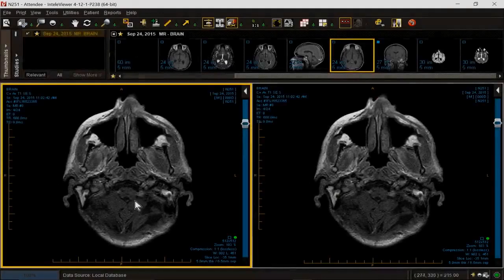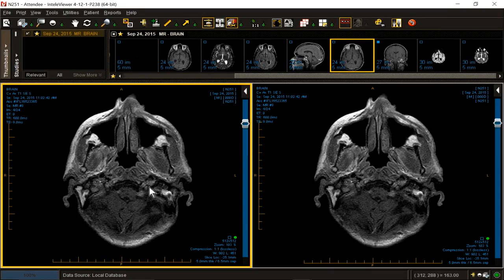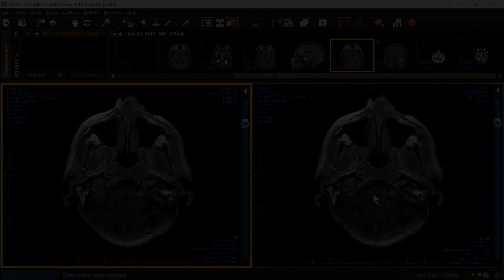If you've got an NF2 patient, you have to go cranial nerve by cranial nerve, starting with the 12th. Did we look at the 12th? I'll bet we didn't. We're pretty rushed for time. But right in the hypoglossal canal, there is a lesion. There's a 12th nerve schwannoma in this patient. There's another small one budding on the opposite side.